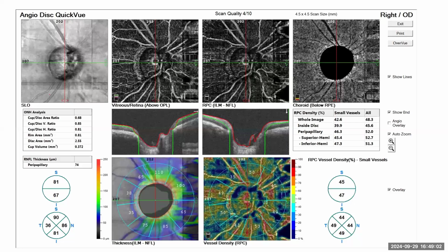You see the scan quality above, it is 4/10, but this is for illustration. The other scan is at the choroid level, and it's not the scan of our interest here. If you look, you'll see that you have a yellow mark that tells you where the scan is from. This is down, down means towards the choroid. This is up here, towards the optic nerve head.